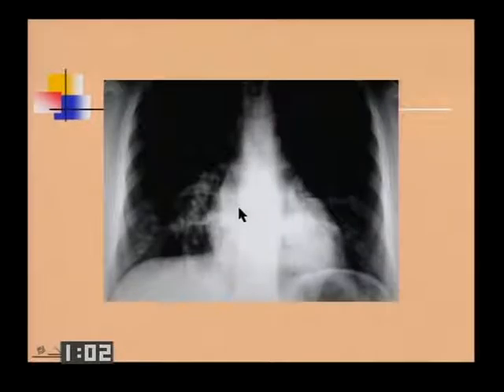This is a child who started off being born through an infected birth canal where there's human papillomavirus. Most of the children born through those canals do well. A few of them will get vocal cord nodules or papillomas, which are then lasered off. Most of the children who have them lasered off do very well. Also, they either recur in a small percent, a very small percent. Those little nodules or a few cells get inhaled and they set up house down in the lungs. And in this child, you can see these little nodules.